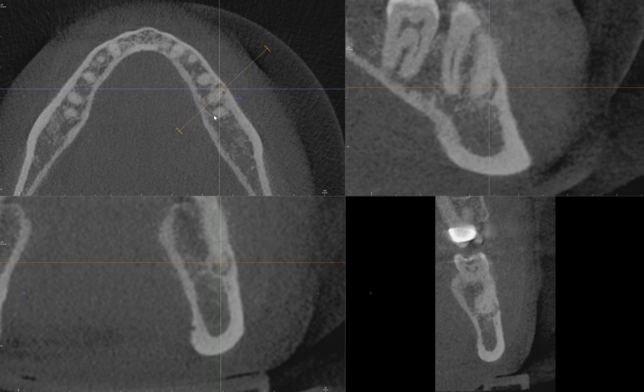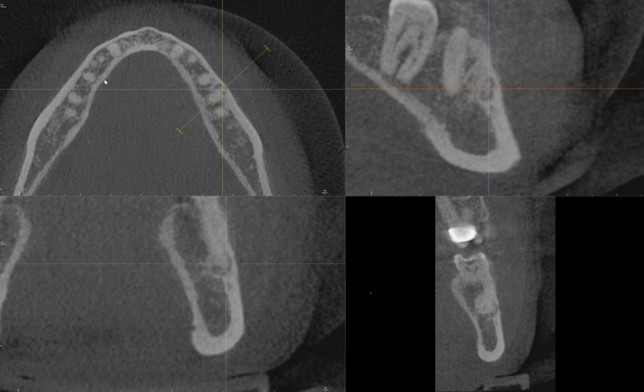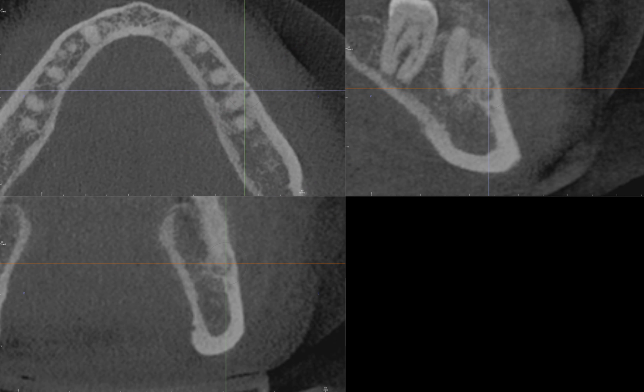Also, let's look at the sagittal view, right? You're seeing the opacity surrounded by a thin radiolucent rim, then followed by the sclerotic border, or the cortical bone in this case. Cortical plate, I mean. So what could this be? Let me remove the custom section, and also hide the crosshair. Right, this is what we're seeing.